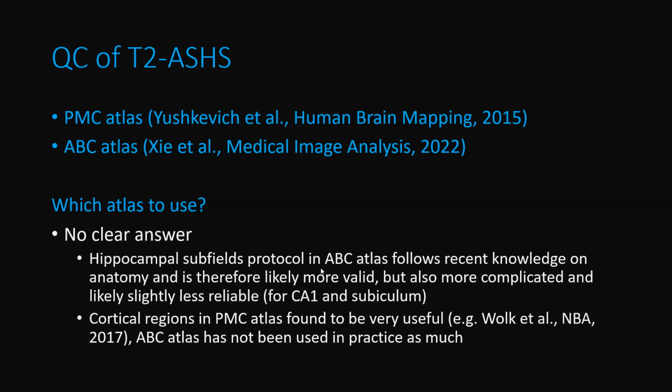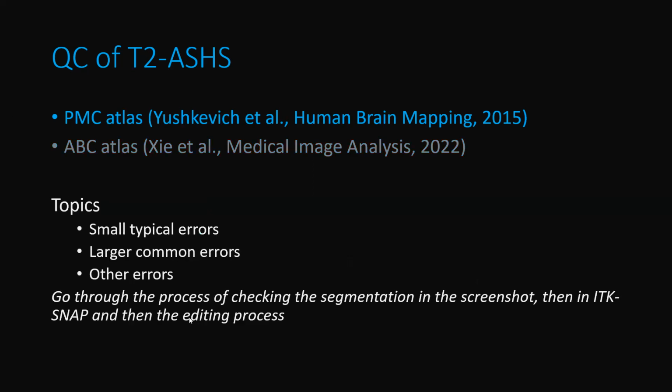Yeah, it's a bit uncertain how to deal with that, because the start of the tail is based on an external landmark, so that could affect how much of the hippocampus is labeled in subfields versus tail. And I think in general, it's good to mention that these atlases are in older adults with and without cognitive impairments. So that's, of course, also a consideration when you choose an atlas.